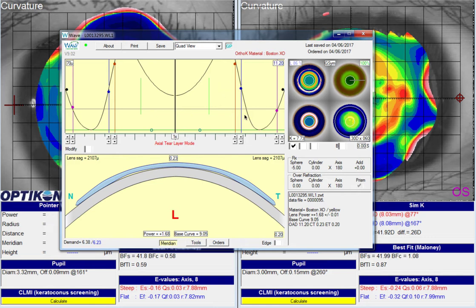Very, very tall reverse curve, a kind of flattish cornea, higher refractive error, so bubbles may be a problem. I think you noticed that, and I'll leave a little note in the email with some tips to help with the bubbles. So hopefully this is helpful.